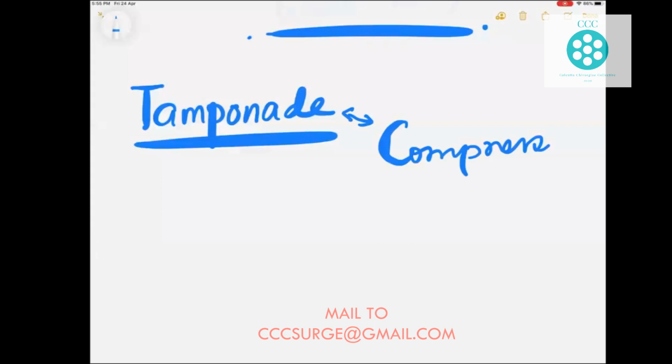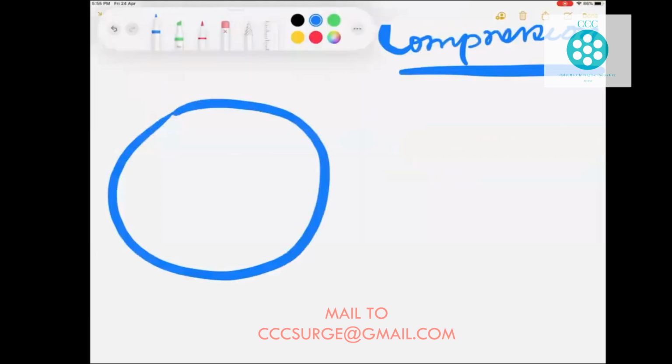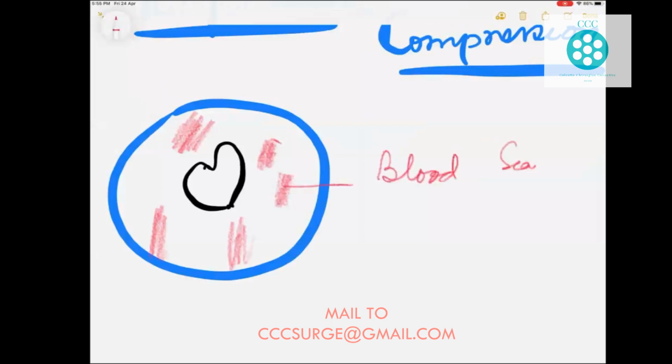If this is the pericardium and this is the heart, the term hemopericardium means there is blood in the pericardial cavity. But this blood can be very scant, for example in pericarditis, tuberculosis, etc.